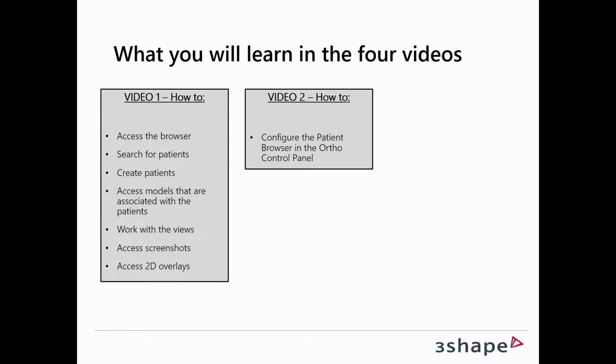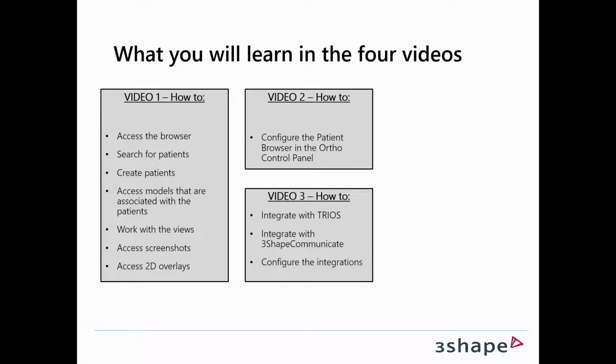The second video will show you how you configure the patient browser in the ortho control panel. The third video will show you how you integrate with the Trios scanner and also with the 3Shape Communicate network, and also how you configure those integrations.